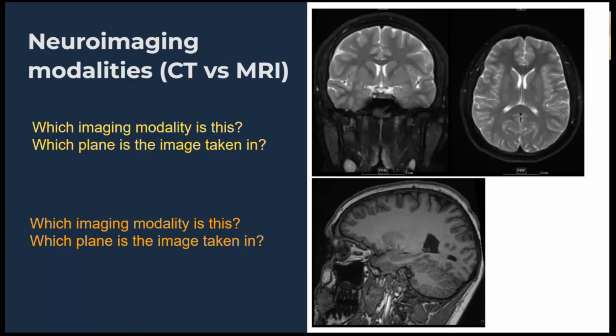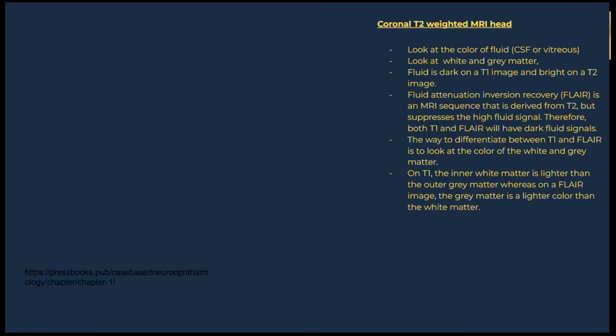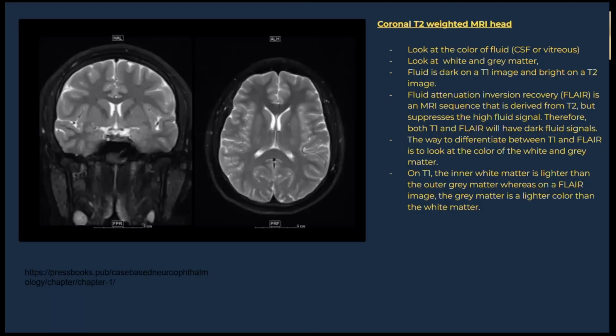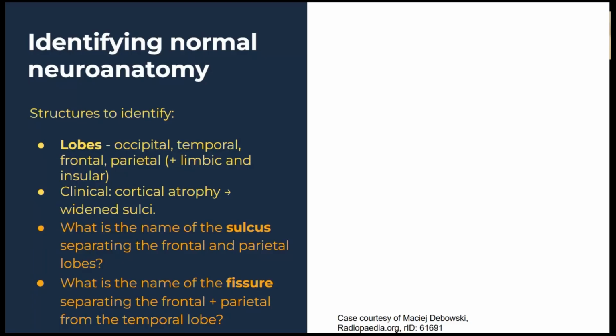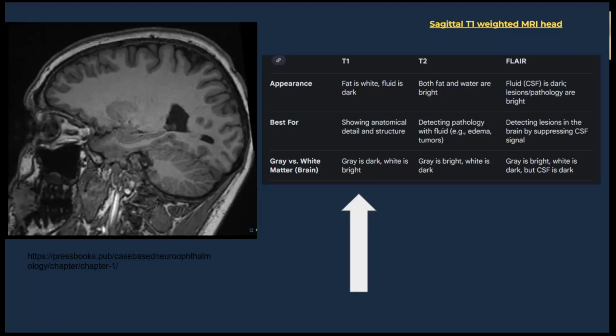And then we can move on from that. One good way to think about it, if you're trying to distinguish between the grey and white matter and the different types of weighting, is to remember that the white matter on the inside of the brain is myelinated, which we learn of as a fatty sheath. Because of that, it's brighter on T1, which enhances fats on the scan.